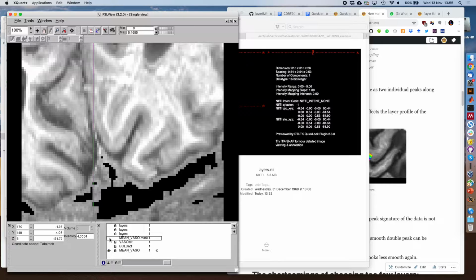So that's all you would need to do the layering. In the mean EPI you have, for example, it's already motion corrected. And noise reduced. Right, averaging is some sort of noise reduction, yeah. You need to have some EPI, and you need to use the same space that you have also for the functional data. Here, the mean is obviously the same data that are used for the functional data, so it's inherently in the same space. So I guess you would call that after the pre-processing then, yeah.